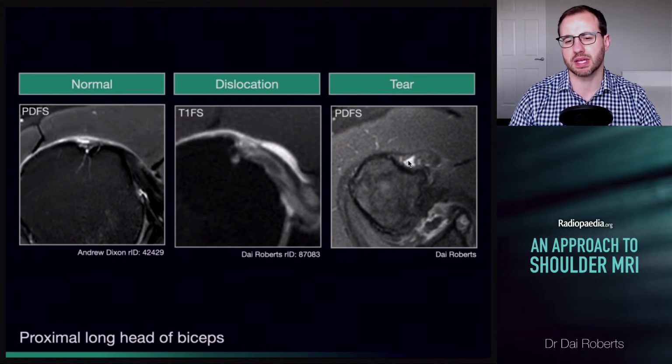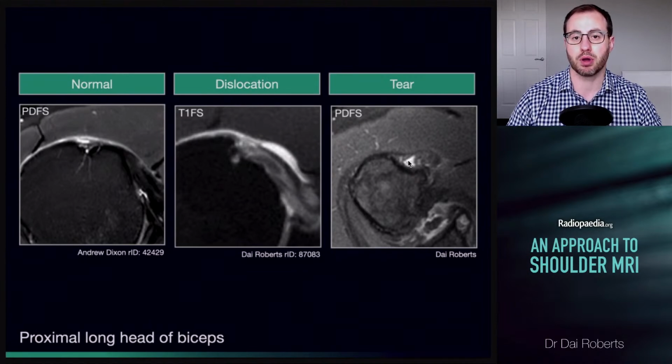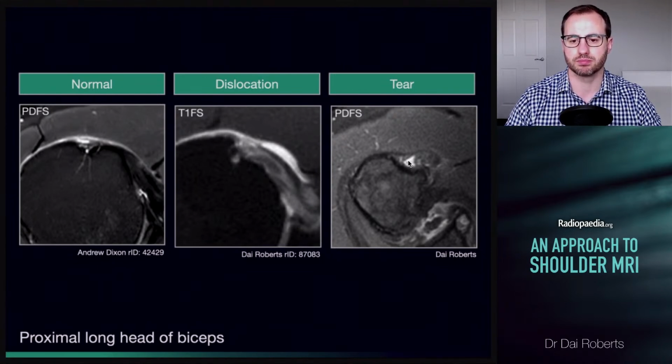And sometimes these can be a little bit difficult to pick up compared to ultrasound, where you can see if someone's got that Popeye sign, whereas MR tends to be focused all around the shoulder itself, and you won't actually catch that retracted muscle belly in the arm.